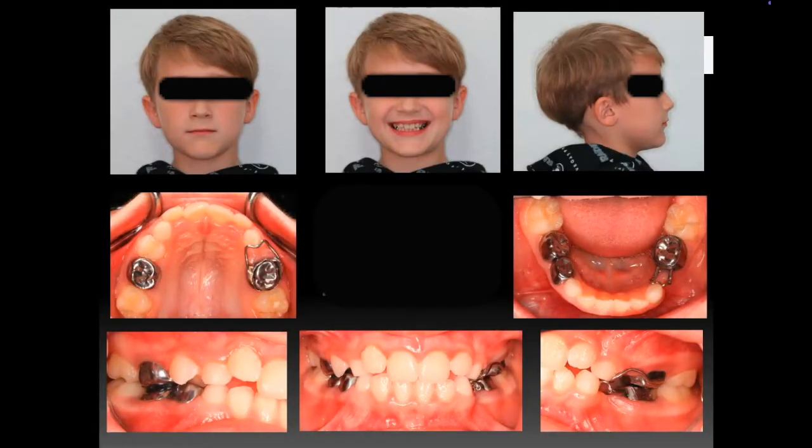Yeah. Now, do these teeth look retroclined or proclined? They look retroclined, right? If you even just look at where the bone is, facially and lingually, the incisal edges of those teeth are tipped more toward the lingual, right? If they were more proclined, you would see those incisal edges closer to the facial buccal plate there. And you see what about the posterior teeth? Are they retroclined or proclined? Yeah, they're tipped in, right? They're tipped into the lingual, right?